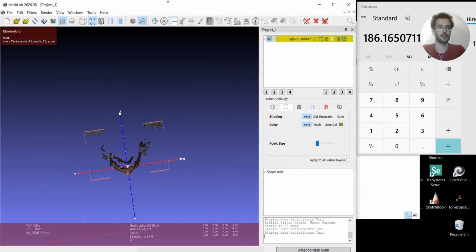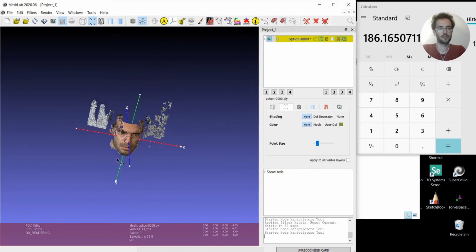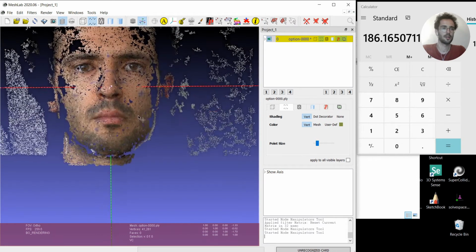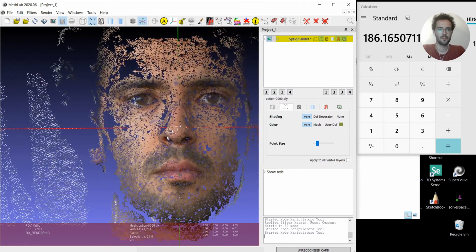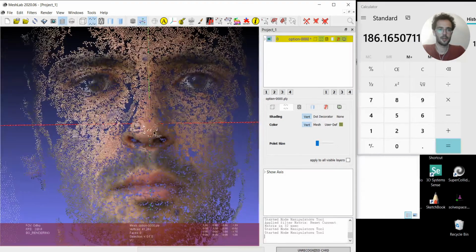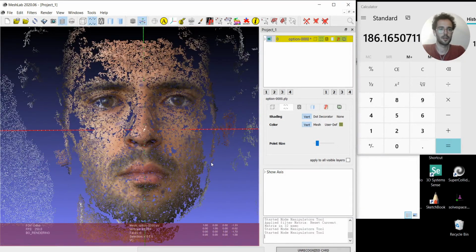So now I can unclick here, rotate my view again, position from the front view, align with the Z axis in my case, or whatever axis you are working on, zoom in a little, and again aligning a bit better with the Z axis, and now I can make another movement.